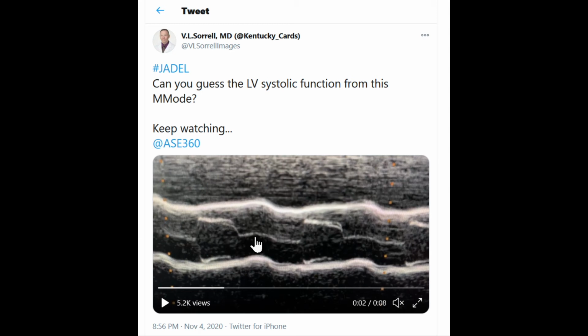Other people suggested this might be an outflow tract obstruction, such as a hypertrophic cardiomyopathy with systolic anterior motion. But in patients where you have a high left ventricular outflow tract gradient, you will sometimes see early closure, but in that case it'll dip down and then go back up, and what you end up with is partial early closure, but not necessarily a slope or reduced pattern here. Also, those patients will normally have a stroke volume that's preserved, so the aorta will actually come up and have significant anterior-posterior motion, unlike this case.